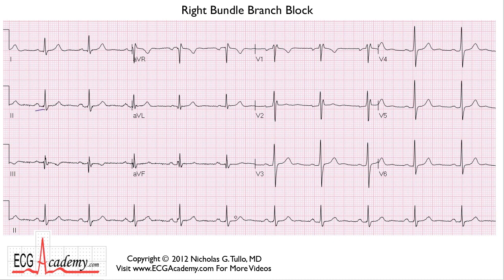And when you look at the QRS complex, it looks almost normal. I think if you measure it, it winds up being about 110 milliseconds. And it's upright in 1 and AVF, so the axis is normal. But when you glance at the precordial leads, this is where you'll see this R prime. You have an RS-R prime pattern. You can see the R prime also in V2.